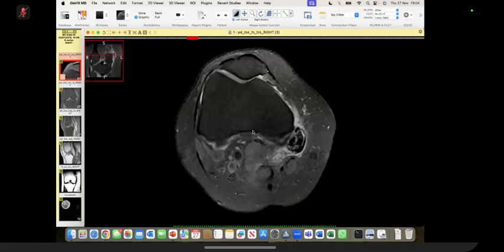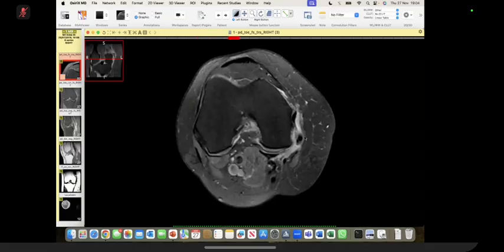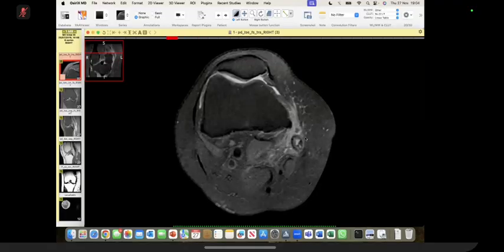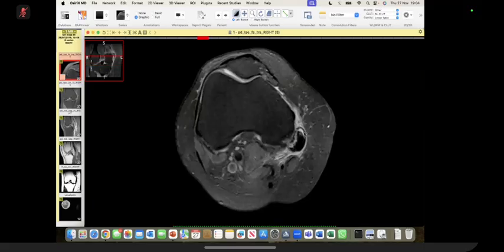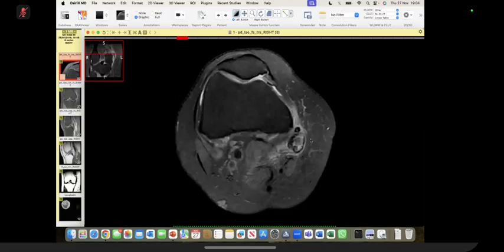And on the other hand, you have seen it on the X-ray, what we call the plain X-ray, you can see the anatomy. So this is the medial side, this is the lateral side, and here we can see that this is that calcification, a lot of edema around it.